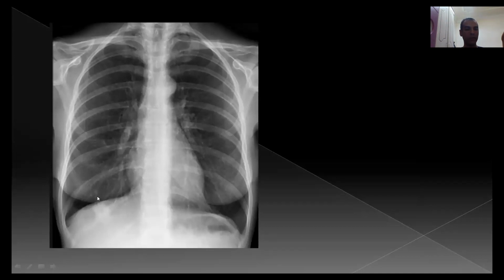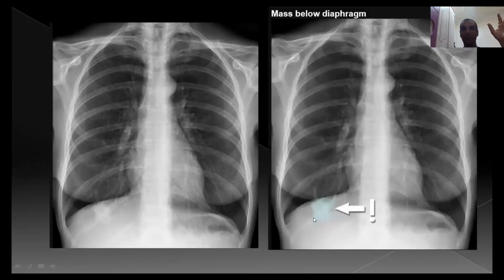Yeah, this one. Look for this one. One of the most difficult points. This one is a classic pulmonary mass. It looks spiculated. There is a suspicious abnormal density; you can just pick up the abnormal density. This is a pulmonary mass in the right lower lung lobe.